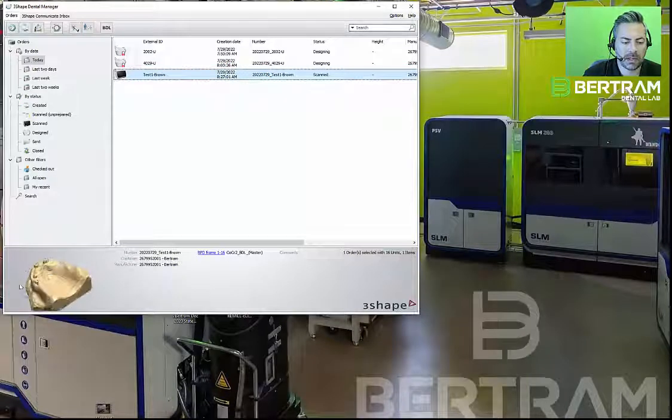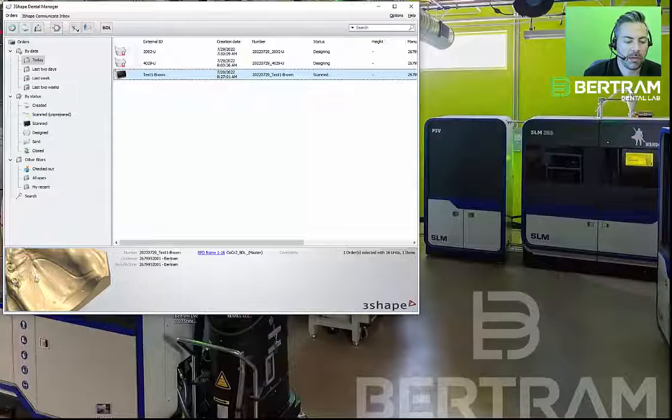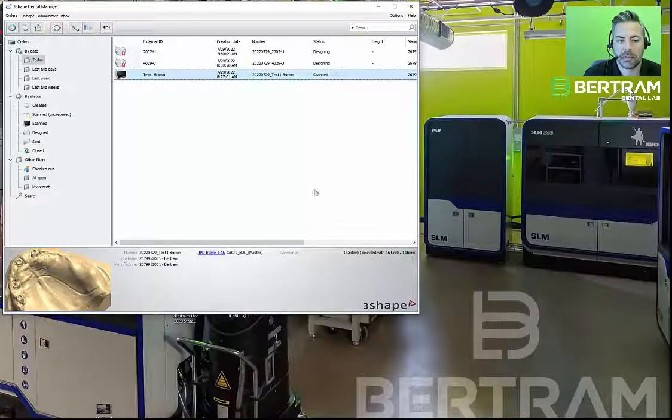So just looking at this case, I can see we don't have an outlined specific design, but there is a bead line in this case. So we're going to do an exposed horseshoe with mesh and then work our way around these locators. So let's just open that one up here.